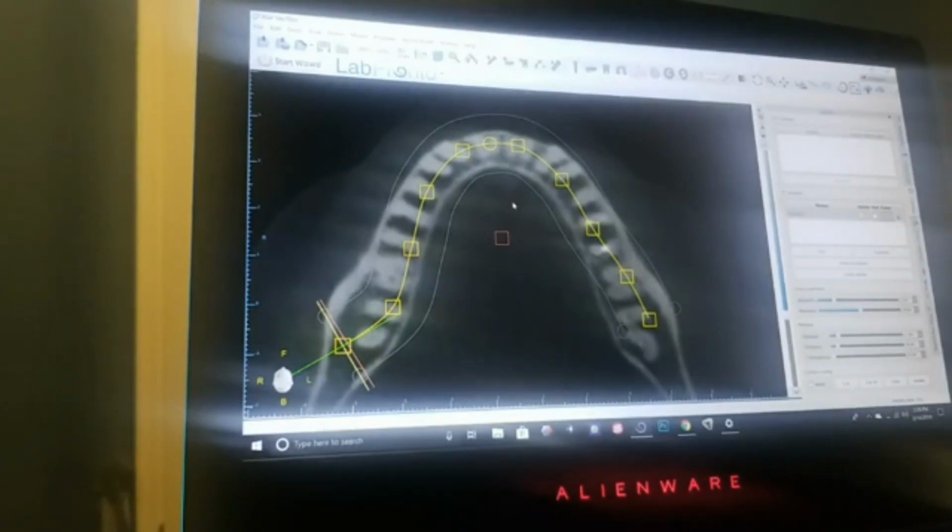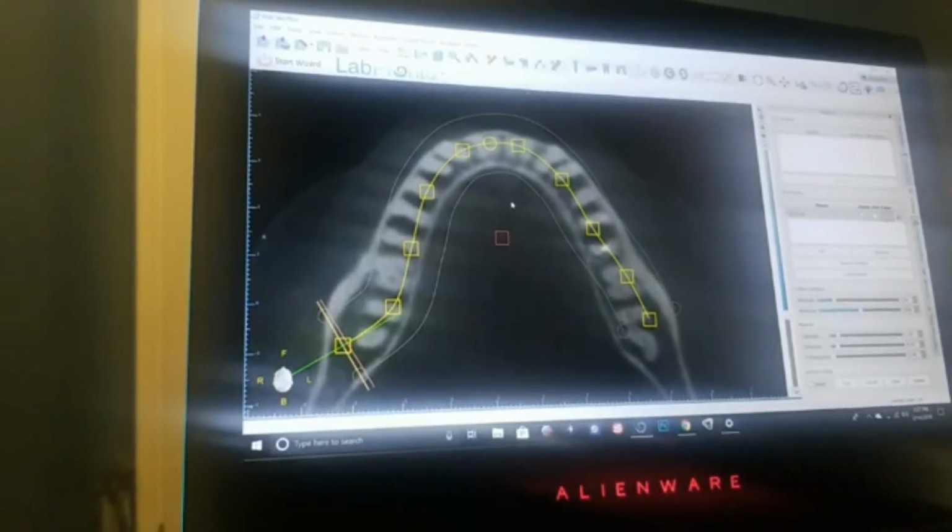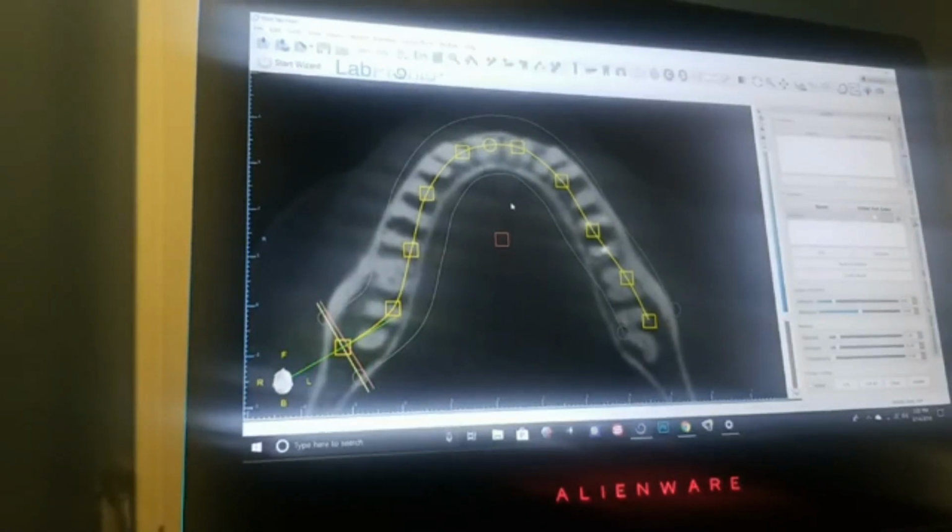Something that I wanted to tell you, and I learned later on that people had a little bit of difficulty understanding, is don't be shy on exploring and clicking on your CT scan. Nothing will happen. I promise you nothing will happen. You want to see something? Click on it. Because once you click on what you want to concentrate on, all the images are going to be coming and forwarding into that specific area.